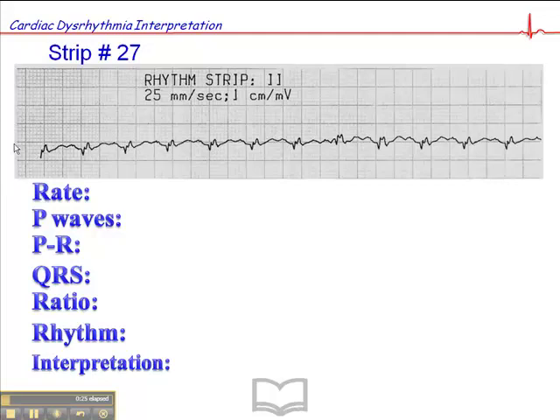Now, the alternative would be to look at some other ECG or some other leads, right? Here we're in lead 2. You might try looking at lead 1 or lead 3 or maybe some of the V leads to see if you can get a different morphology, something that's easier to read. Well, let's start with the heart rate though.